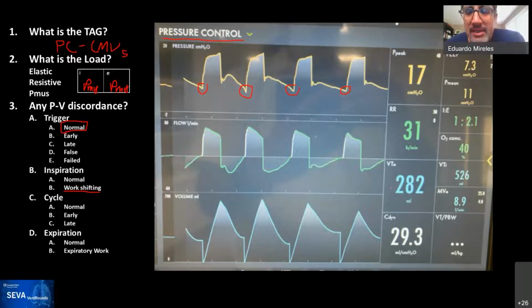Very good. So in this case, it's a little bit tricky. I didn't put the tidal volume for this patient there, but you see immediately the discrepancies in tidal volume. You have the inhaled tidal volume and you have the exhaled tidal volume, and this is a common issue as you're walking by on the ventilator. Different ventilator manufacturers display the tidal volume differently. Some just display one of both tidal volumes, the exhaled or the inhaled. Some display both, but they give priority to one of them. So if you were walking around caring for this patient and you saw this tidal volume of 282 versus 526, which one is the patient getting?